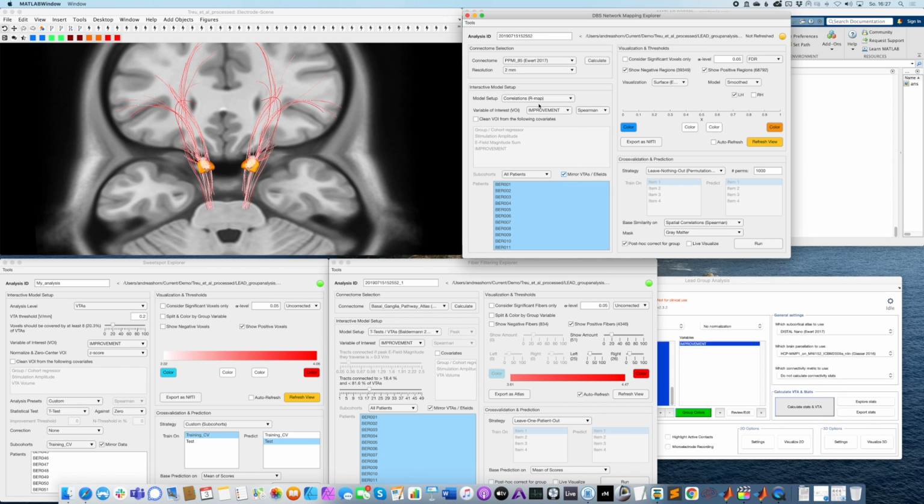And again, we will calculate correlation values across each voxel in the brain. So we will also get a p-value. So we could again only consider significant voxels. Again, using uncorrected form, we wouldn't correct for multiple comparisons, and so on. So I've explained that stuff before. This is showing negatives and positives, and then the question is how to visualize results.